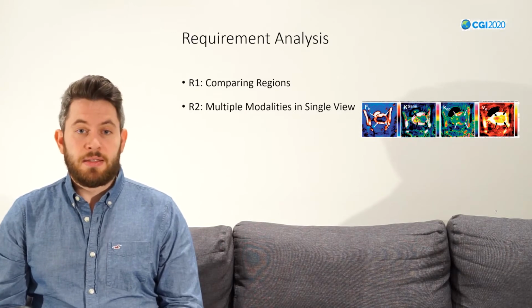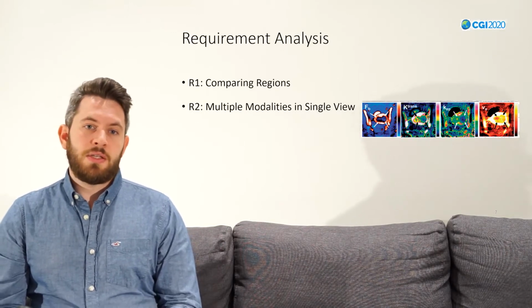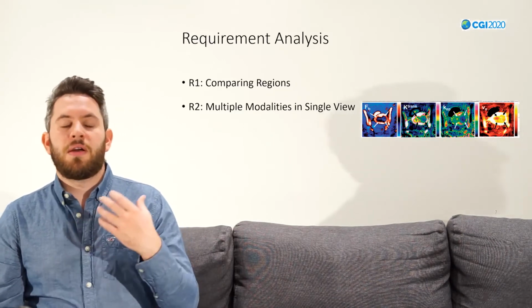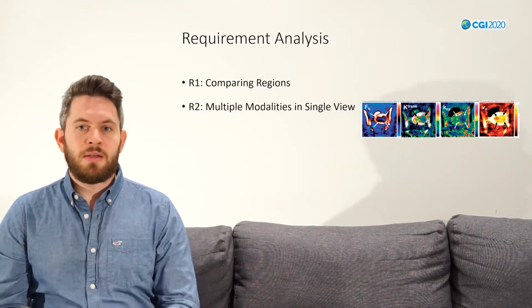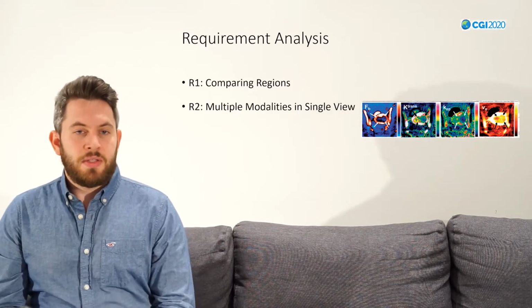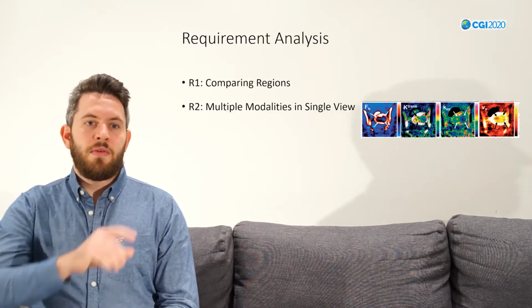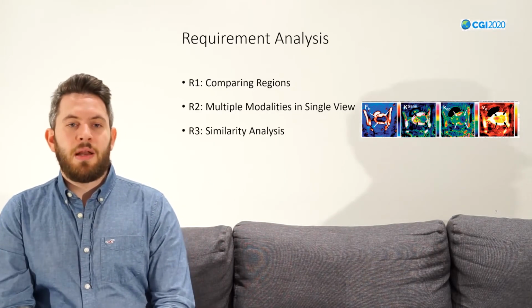Multiple modalities in a single view. So this is really challenging. As we've seen before in the related work, we had up to 5, but in our case we can have up to 7 or even more modalities. And the radiologist told us they would like to have it in a single view so that they could have a nice overview. Then we have requirement 3, the similarity analysis.